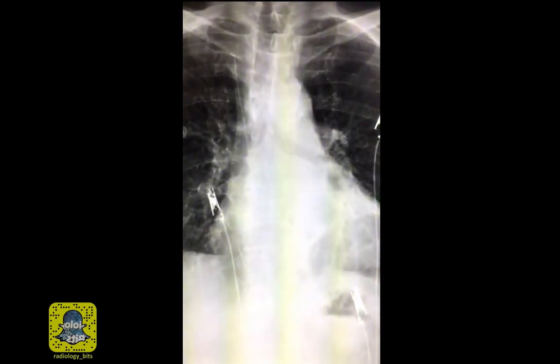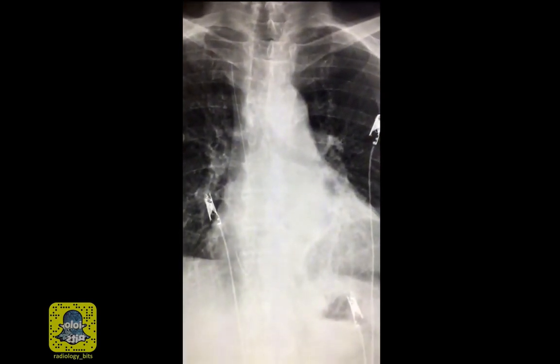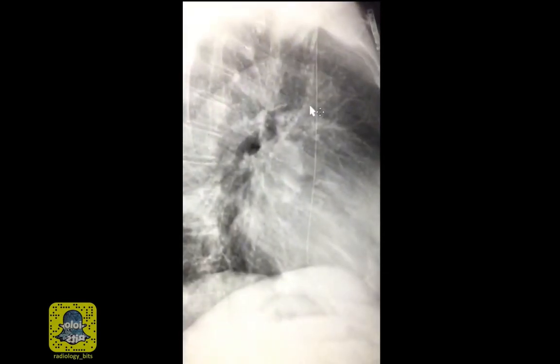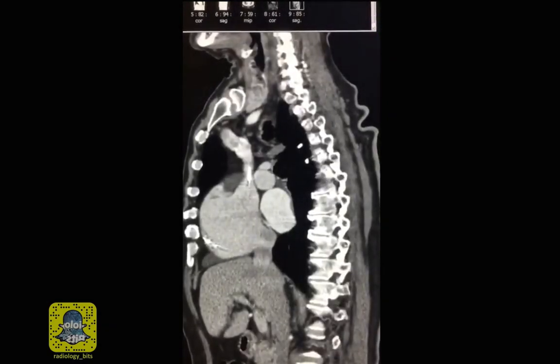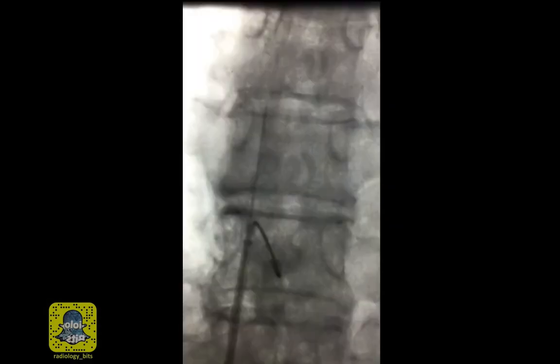We know from prior teaching cases that lots of things could be extrinsic to the lungs, but look at two projections. If something appears in the heart or in the lung on two projections, it is indeed in. Fourth, when in doubt, performing a CT to confirm the location of the abnormality is not a bad idea.